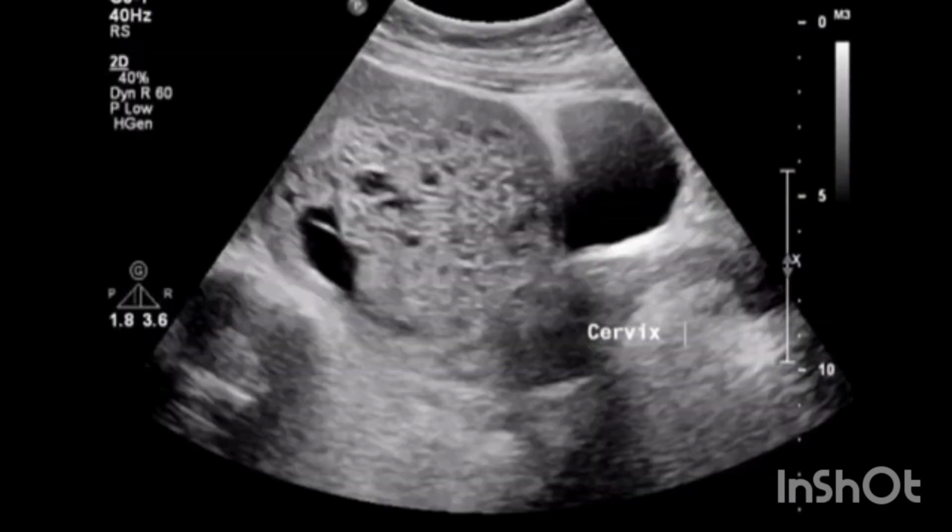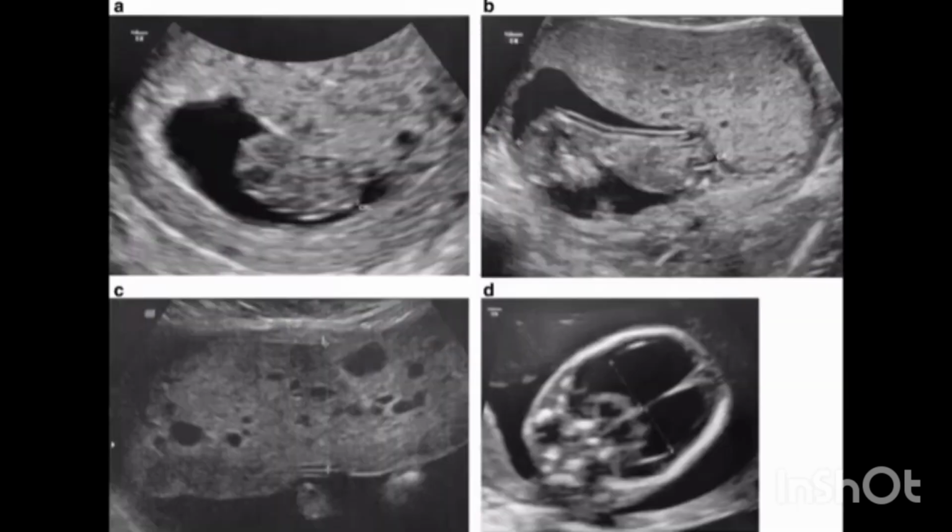3. An amniotic cavity, gestational sac, either empty or containing amorphous, inappropriately small fetal echoes, which may be surrounded by a relatively thick rim of placental echoes with intermingling cystic spaces. 4. Presence of a well-formed but growth-retarded fetus, either dead or alive, with degeneration of fetal parts, frequently hydropic.